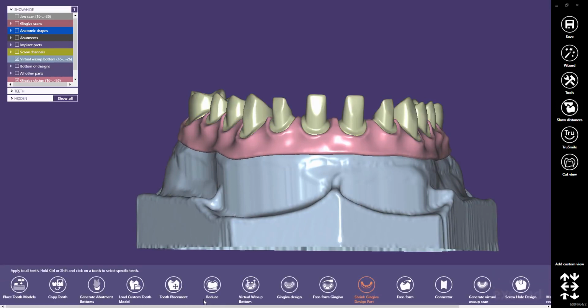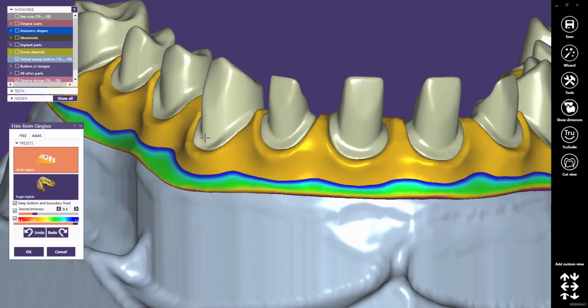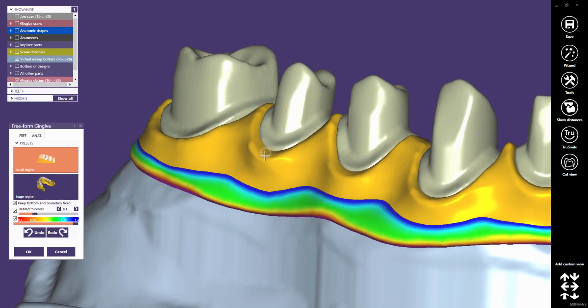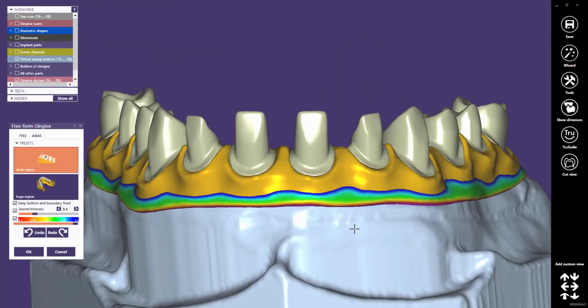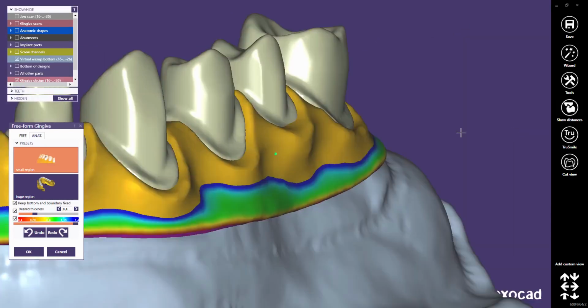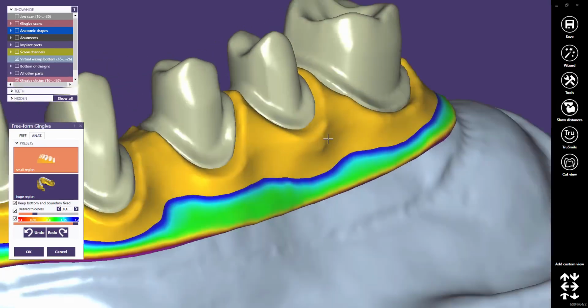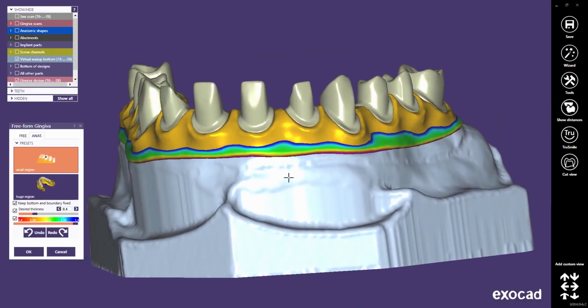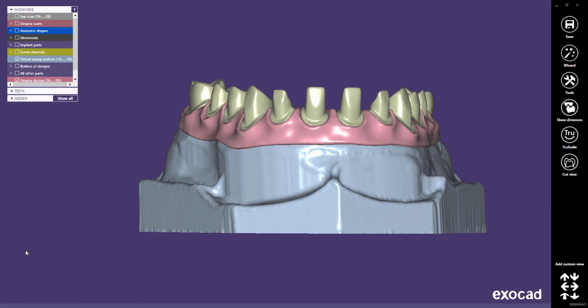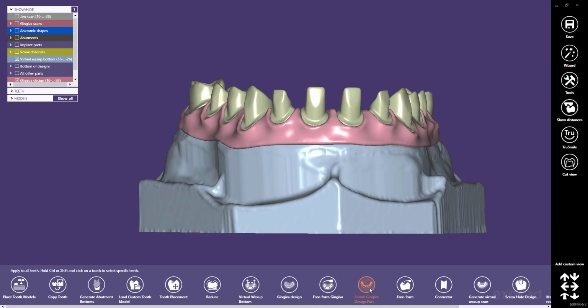Next, stay in Expert mode and choose Free-Form Gingiva. Try to avoid overlapping the gingiva and thimble crown borders. When you are done, click OK to close this dialog. Still, stay in expert mode and proceed to the Shrink Gingiva Design Part step.